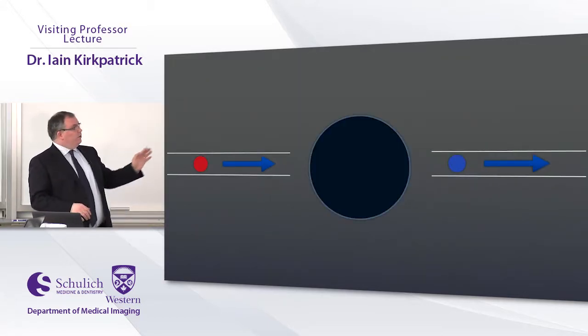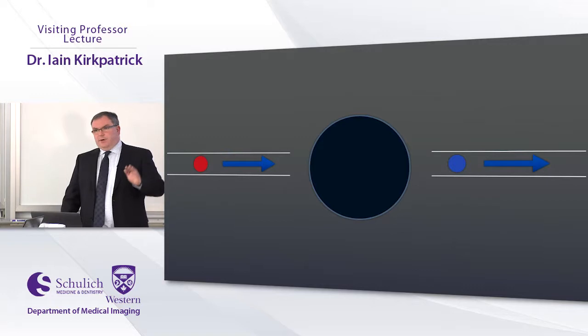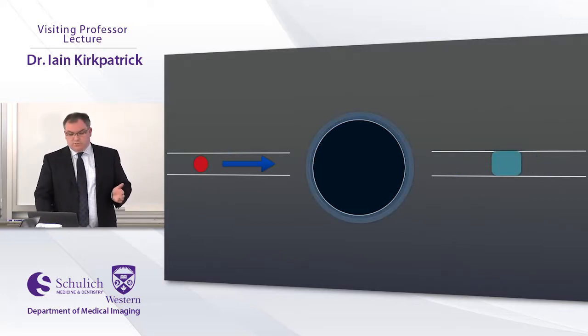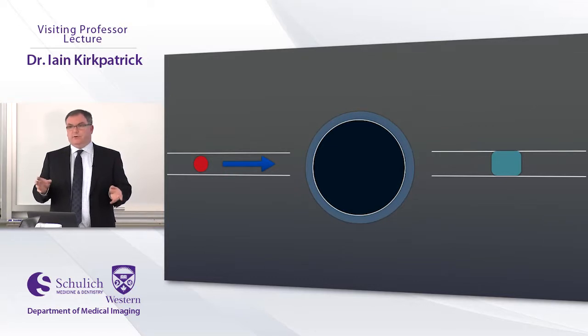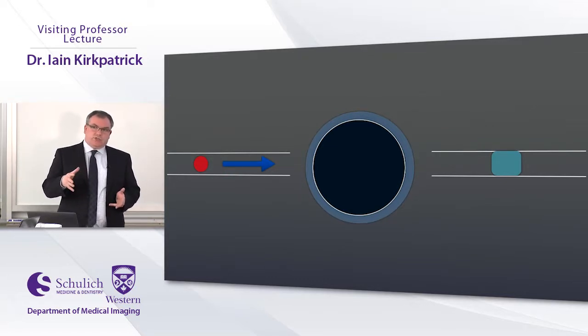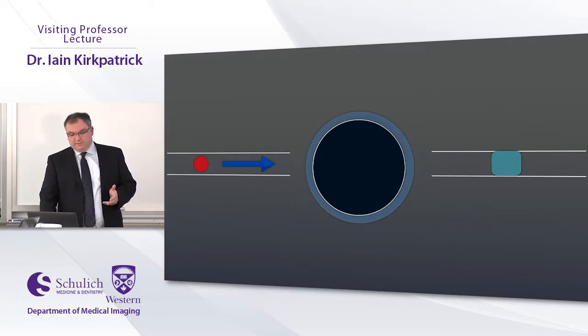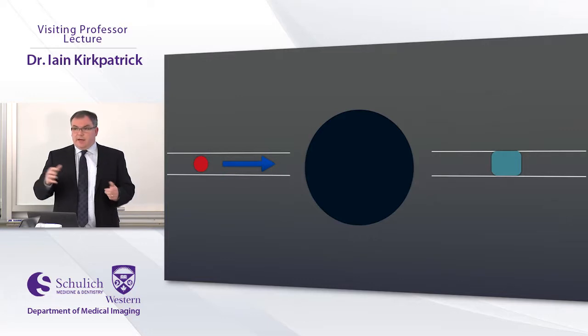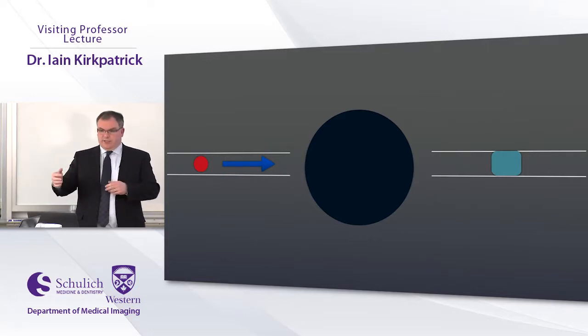So let's go back to our normal bowel loop, and now let's talk about occlusion of venous outflow. So when this happens, because of congestion, wall thickening is actually a prominent and early finding. If you have some venous outflow persisting, you might actually get a hyperenhancing wall, but if the venous outflow is really obstructed and occluded, then you may get hypoenhancement because that will eventually transmit pressure back and affect inflow.